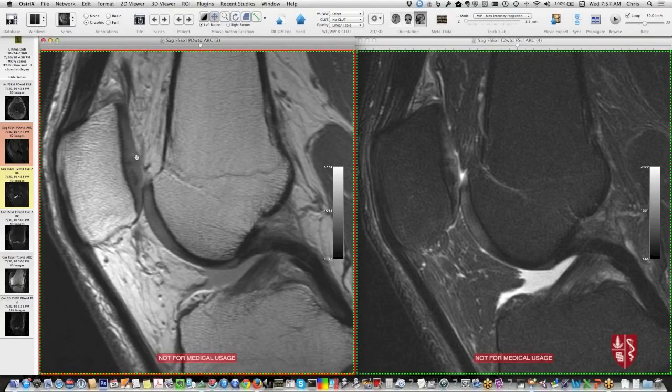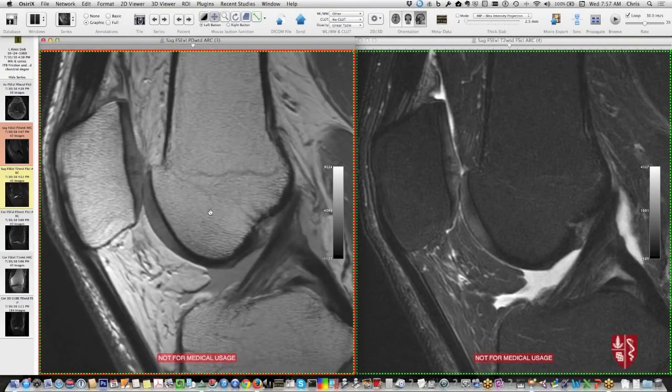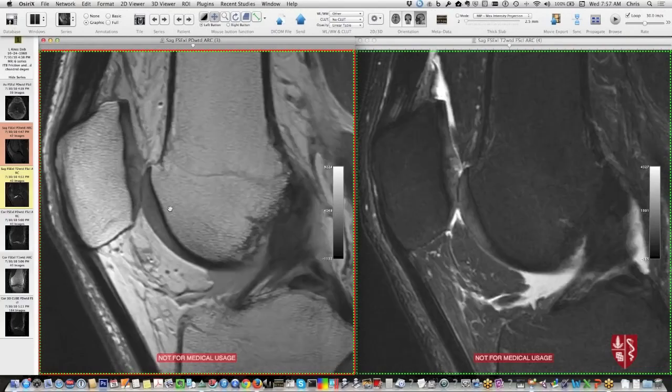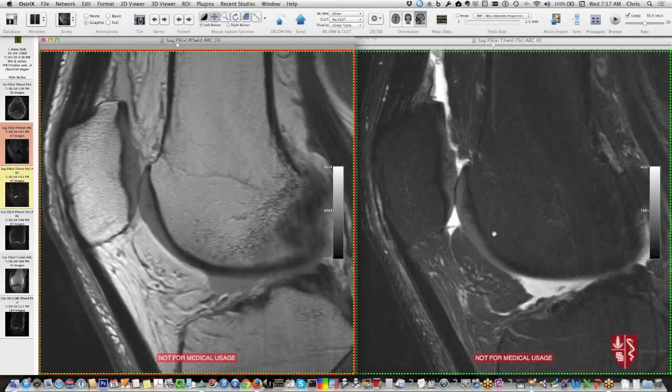It's kind of been likened to a pear shape, so thicker in the mid to lower portion than in the upper portion. The trochlea is a common spot for chondral degeneration, and so here along the femoral trochlea, it's nice and smooth and uniform in thickness. You sweep around, seeing the midline of the trochlea here, sweeping around, and all looking quite good there.